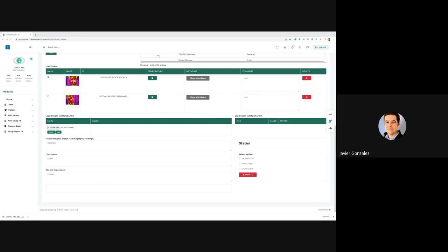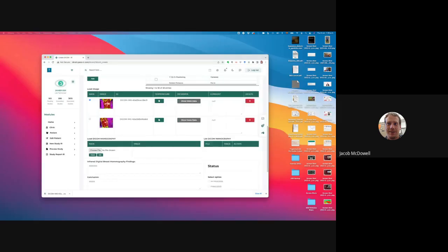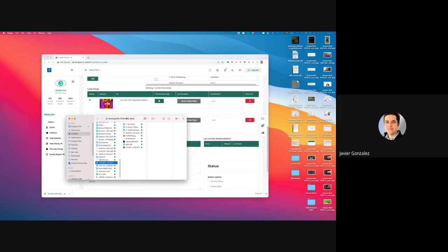Gotcha. Hold on. So you guys plan on making this a desktop app as well, or just a website? We can do a desktop app, but I think the web-based application is the way to go. I mean, that's what people would buy all the time. Maybe it's because this is maximized. Let me see. How have you guys viewed this in light of HIPAA? Well, here it is.